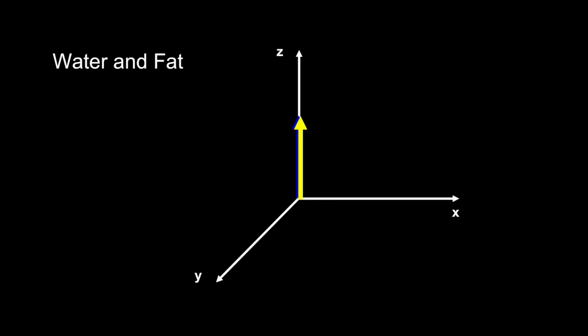Are we trying to differentiate tissues based on their T1 relaxation or their T2 relaxation? No sequence is purely T1 or T2 weighted, but a pulse sequence is designed to try to bring out the T1 or T2 characteristics of each of the tissues to differentiate them. And we'll briefly talk about how that happens in the next section. So let's start diving into what tissues are going to look like on these T1 and T2 weighted images that you're going to be looking at, using the concepts that we've learned of relaxation.